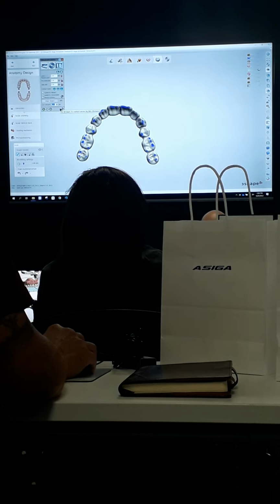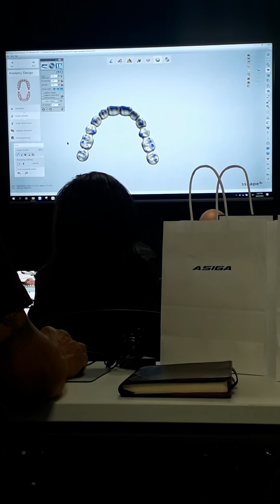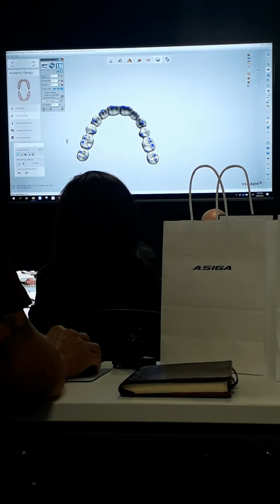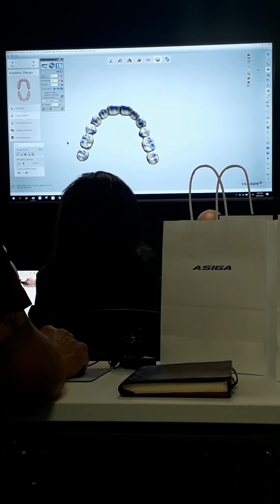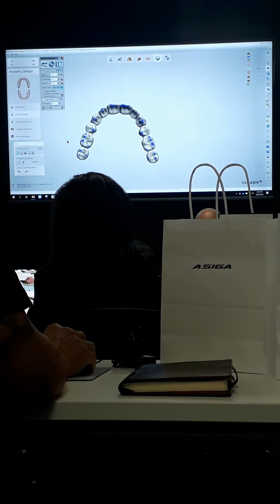Based on the value that I have here, when I hit Adapt Designs, it's going to adjust the blue spots on both the upper and lower arch by 0.1. So it'll adjust the upper by 0.1 and the lower by 0.1, a total of 0.2. You don't want to do this a lot, because your articulator is going to start to drop from the 0 position and over close. So you only want to do this a couple times.